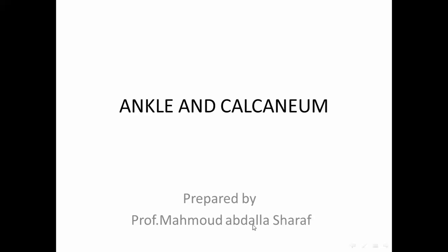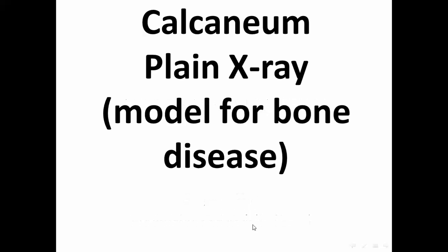This presentation will deal with the imaging of the ankle and calcaneum. The calcaneum in the plain X-ray will be taken as a model for bone diseases.